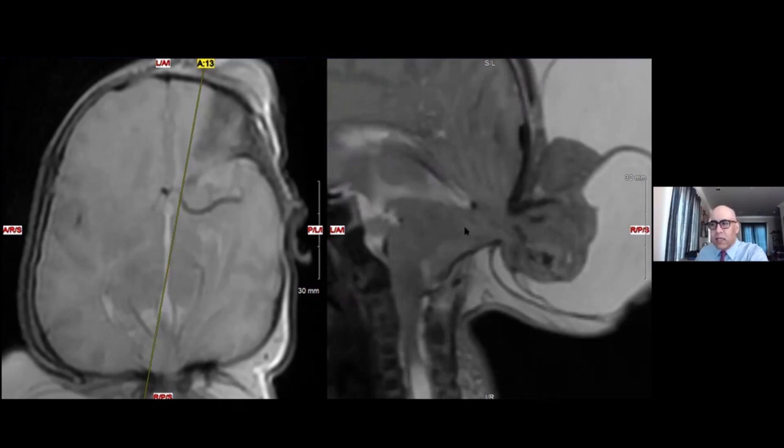A Chiari type 2 malformation is intracranial developmental abnormality that is secondary to a myelomeningocele in the spine, typically lumbosacral. And because of that, you get a constant CSF leak that results in low intracranial pressures and resultant sagging of the brainstem and cerebellum into the foramen magnum. That sagging takes place during development, so you get an enlarged foramen magnum. In this case, we have some of the same features of a defect, but instead of it being a spinal defect, it's a defect in the posterior cranial fossa here. So an encephalocele that results in some of the features that you sometimes see in a Chiari type 2 malformation is something that can result in a clinical phenotype referred to as a Chiari type 3 malformation.